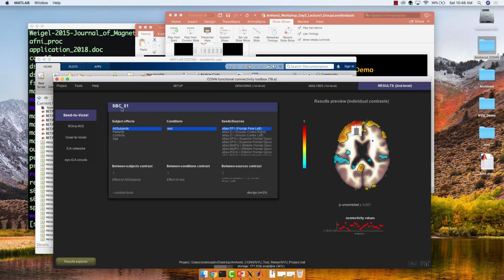So you have 25 subjects, 4 scans or so. Are you going to have a 100 length contrast vector, or are you going to have 25? You would have 4 separate 25 contrast vectors that you have to input individually. That'll be fun. I know. But once you're done with it, you're done, right?